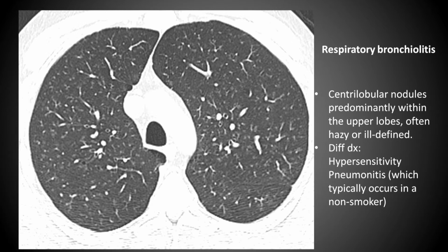thick. So sometimes I'll see a patient referred in with a CT from an outside facility, and the slice thickness on the lungs will be 5s. Now, I don't know if they're reading them that way. Maybe they kept the thin cuts for themselves. You're not going to see this on 5s. You're probably not even going to see it on 2.5 millimeter slice thickness. So we routinely will look at our lungs on 1 or 1.25 millimeter slice thickness, depending upon which CT scanners they're on.